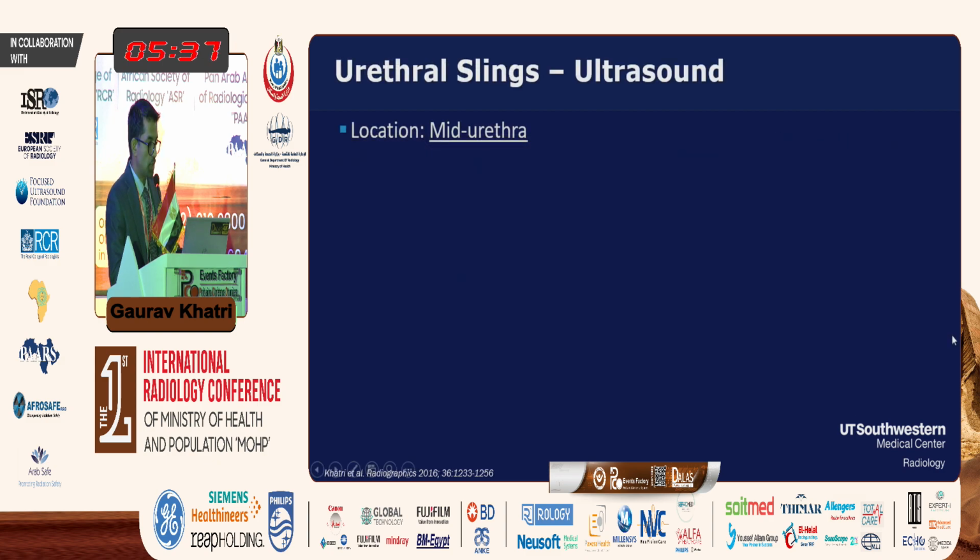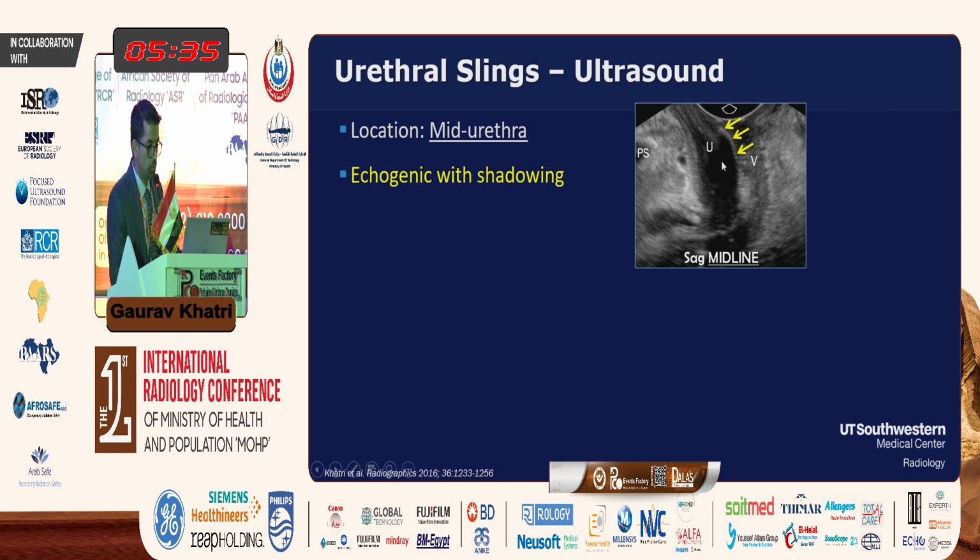So on ultrasound, this should be at the level of the mid-urethra. This is a transperineal ultrasound. This is the urethra, and this echogenic line here in the midline is the sling. It can be hard to see, but you're looking for an echogenic line that is parallel to the wall of the urethra in the midline. It should be echogenic, and it should cause this shadowing because of artifact from the sound beams not being able to pass through the synthetic material.